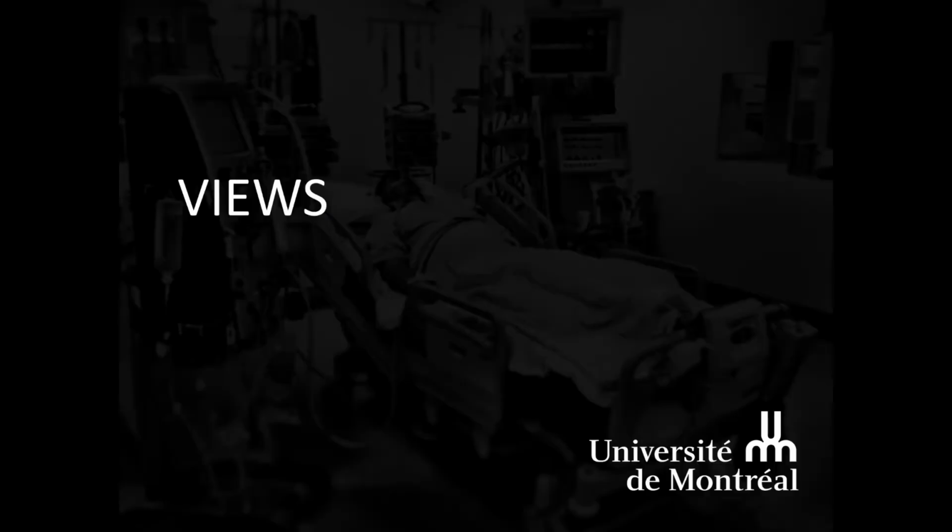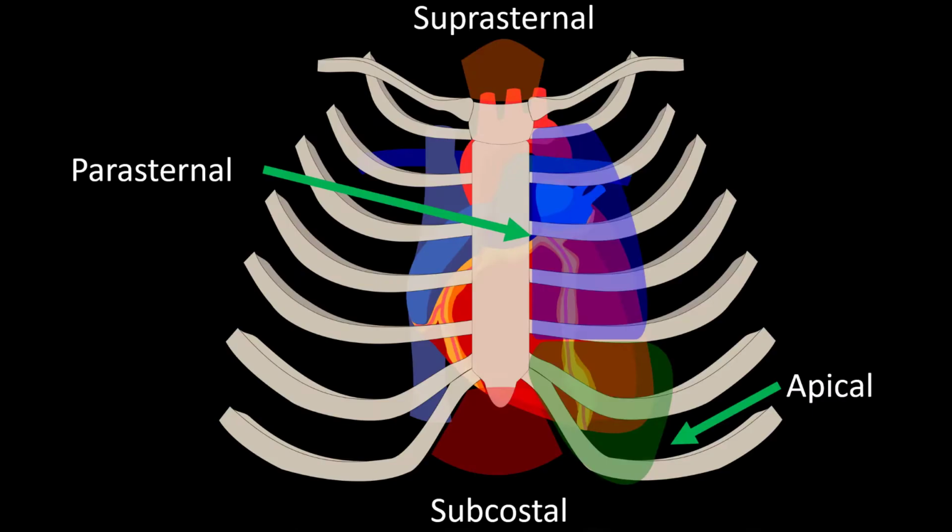We'll start with the full spectrum of views necessary for proper LV assessment. There are multiple areas where one needs to go to find all the necessary views for proper LV assessment. These shown on the slide are the more common ones. Please note that additional views can be obtained from right parasternal and transhepatic views as well as off-axis views. Remember that in a lot of patients, not all windows will be easily accessible. This is due to the heart position favoring a specific window at the expense of another.